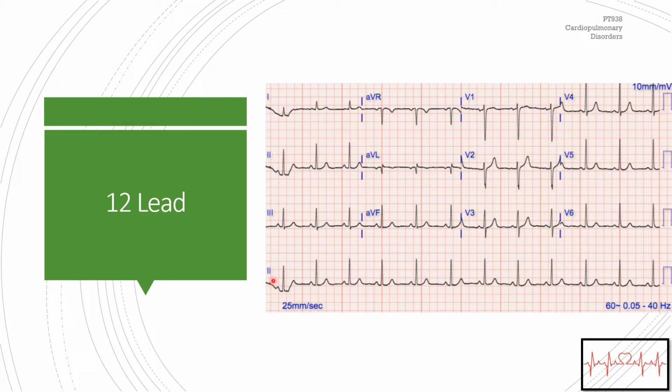And then you'll see down here at the bottom that there's another tracing, and this EKG tracing is choosing one of those 12. Sometimes it can go up to 3 of those 12 that are there to watch more continuously than the snapshots you're seeing on this piece of paper.